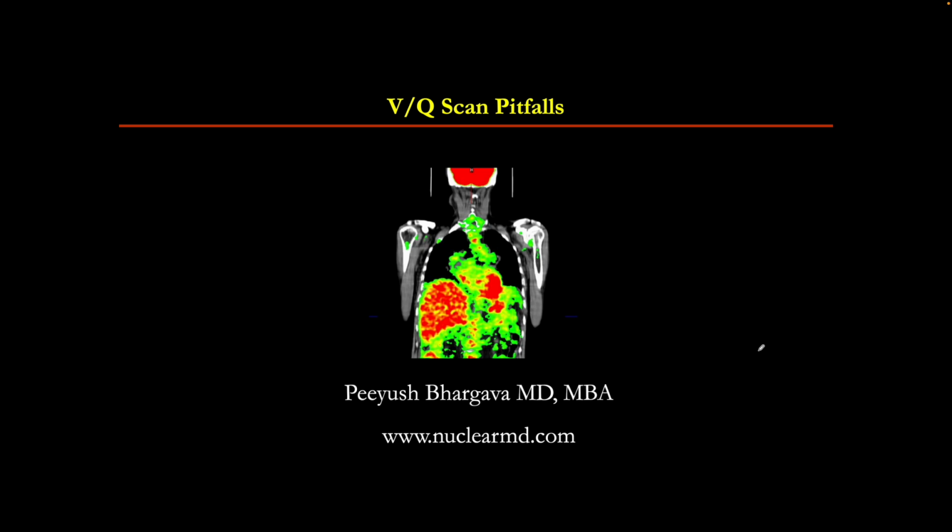In this short video, I'm going to show you two VQ scan pitfalls. Here is a VQ scan that was submitted for interpretation by the nuclear medicine technologists. The ventilation images are in the top two rows, followed by the perfusion images in the bottom two rows.